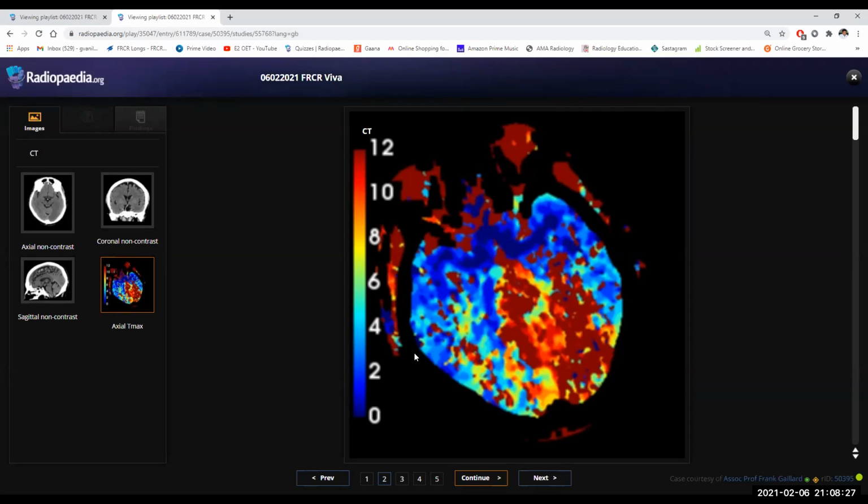Edema has already occurred. So you would like to get the history, and if the patient is in the window period, then we will go for the thrombolysis, and post thrombolysis you can take a CT for further evaluation. Okay, we will go to the next case.